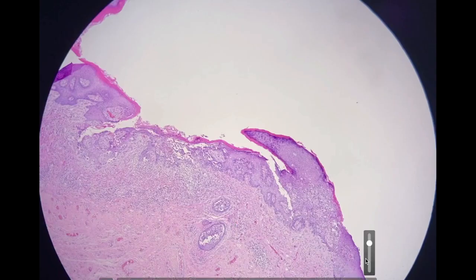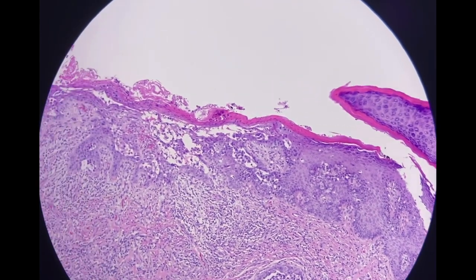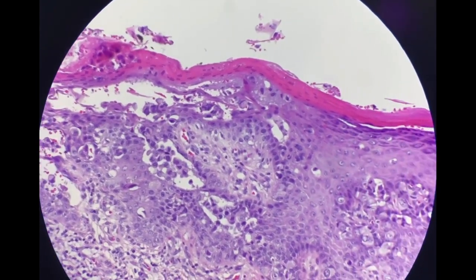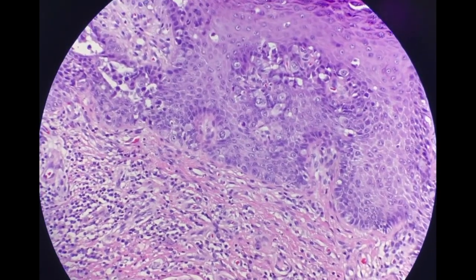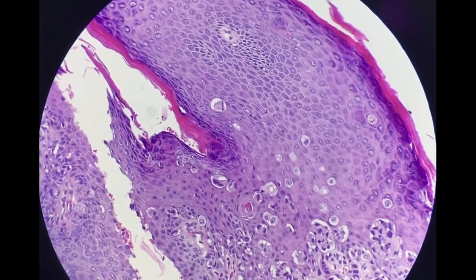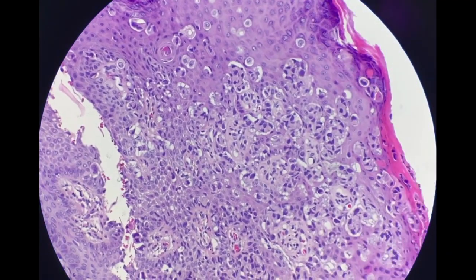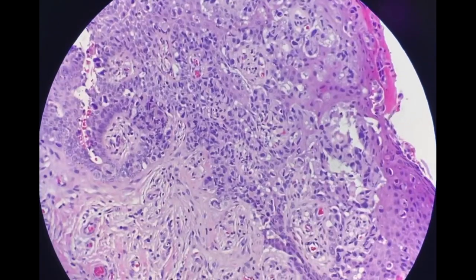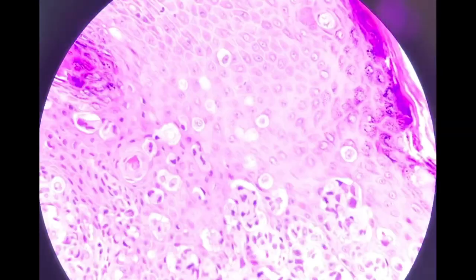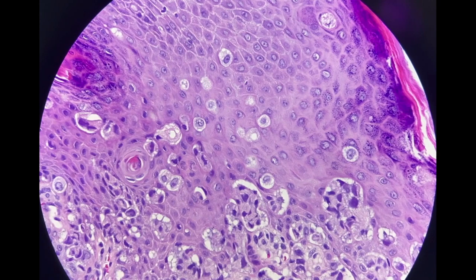Okay, let's have a look in this video, the hematoxylin and eosin. We see epithelium with irregular surface, with hyperparakeratosis and with acantholytic dyskeratotic-like lesions. But if we go to high magnification, we can see the typical cells in the basal layer and in the middle of the epithelium, with big and clear cytoplasm, sometimes organized in nests, and spreading as single cells to the surface of the epithelium, sometimes alone. Note the atypical nuclei with this clear and abundant cytoplasm.